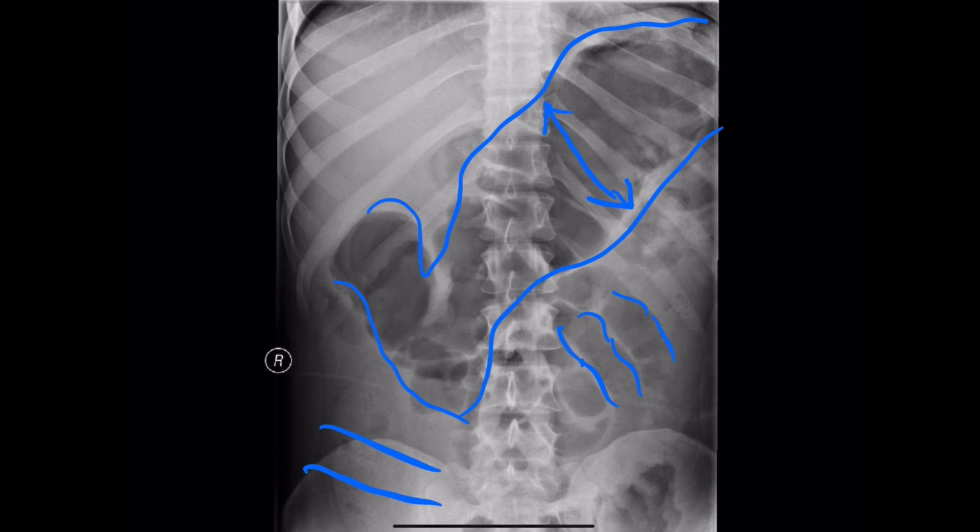The second thing is that small bowel loops, I'm going to just do a little diagram here, tend to have what are called valvulae conniventes that completely cross the bowel. Remember that term. Valvulae conniventes. Yeah. And let me preempt you and say in the colon, it's something to do with haustra. Yes, exactly. So in a colon, you're going to tend to see haustra, haustral folds like so.